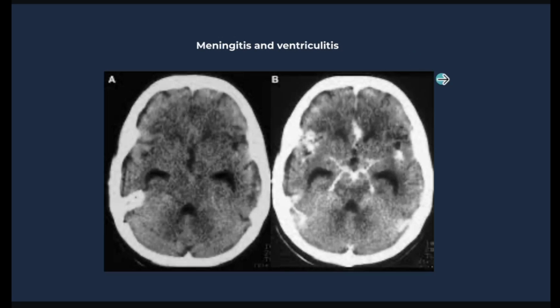So this is the sad face. But yeah, so this would be a sad face. You can imagine the ventricles. These are the eyes, and then this is the mouth. And here you can see the star sign as well in the middle. So this is how you could be differentiating from hydrocephalus. It's the different ventricles that are being enlarged there.